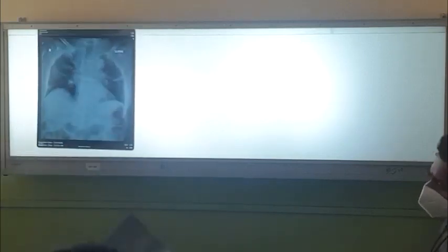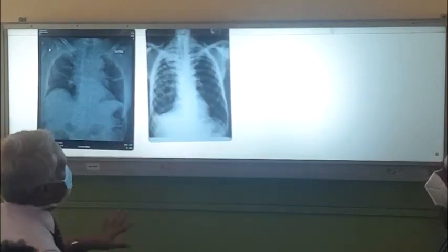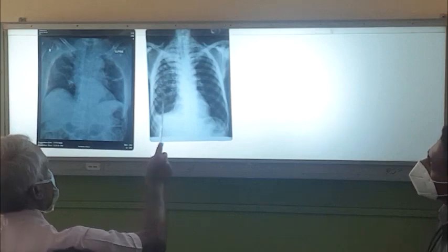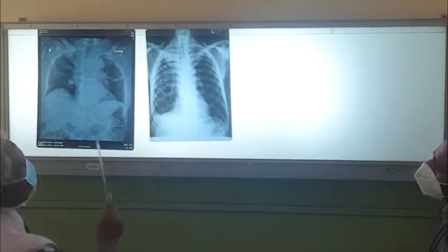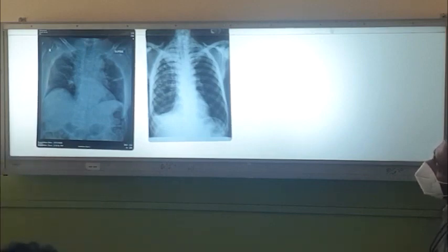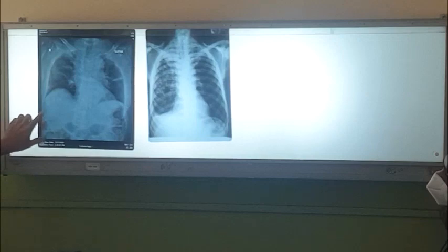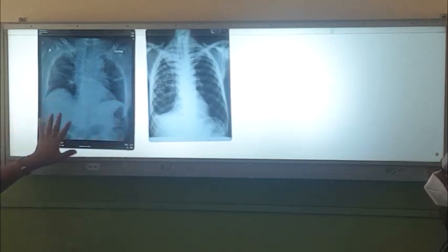Right, these two X-rays I am keeping to teach you something else, right? This is the patient with TB, and all these changes are TB, right? The pleural thickening, pleural fluid, and these patches, all due to sputum positive PTB. But that is not what I want you to see. And this patient has a diagnosis of multiple myeloma. Okay, a lot of fractures and all. So you can see multiple fractures. This is a diagnosis of multiple myeloma.